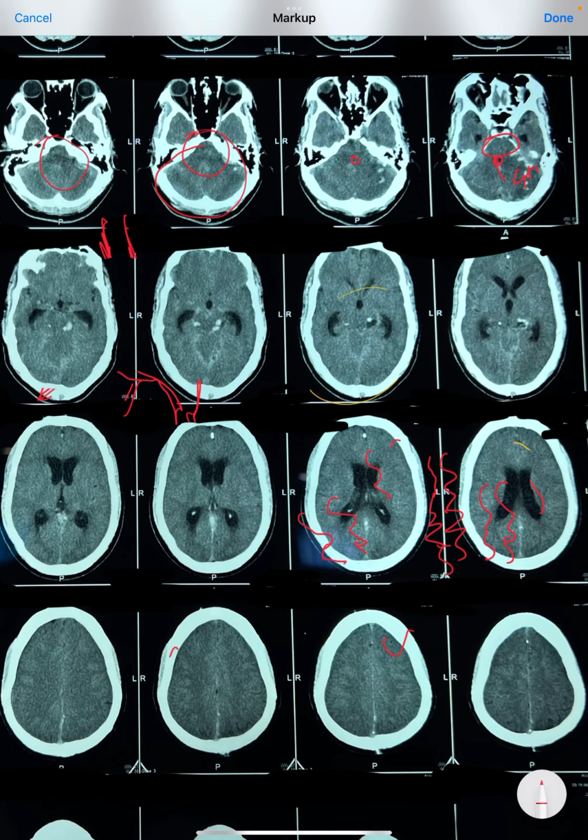So if there is excess of pressure in the venous channels, you will automatically be able to see these veins. This is just like caput medusae, which we see very commonly in ascitic patients, in CLD patients, or just like the esophageal varices, where these veins will be dilated and they will be tortuous.